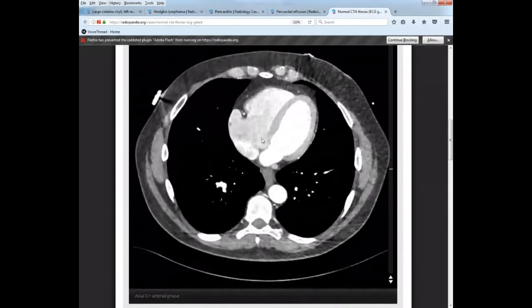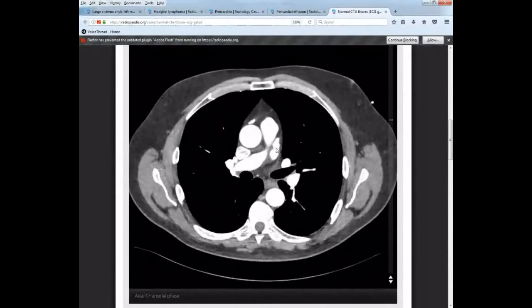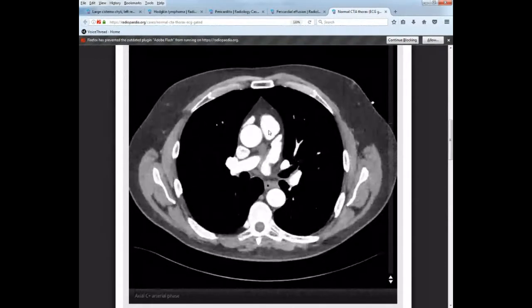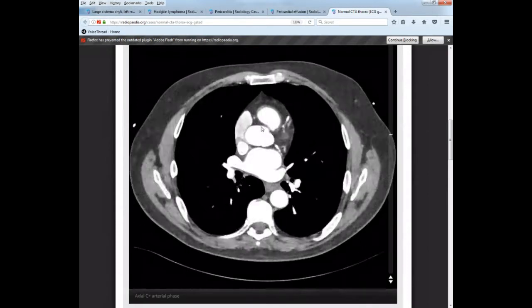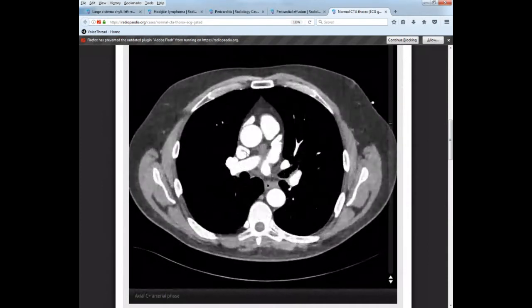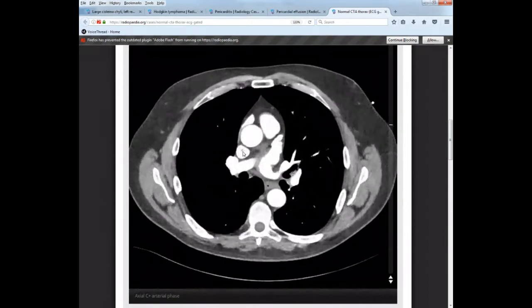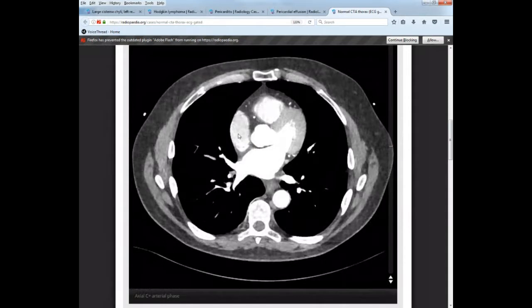We also have thinner slices. Let's do that again with contrast, because this is going to actually help you to see the chambers as well. All right, so let's go down, follow the main vessels. Let's follow the circulation in the heart. So first, what's coming into the heart? The superior vena cava. Okay, here's your superior vena cava right here. Coming down, down, down. That is going to empty into your right atrium.